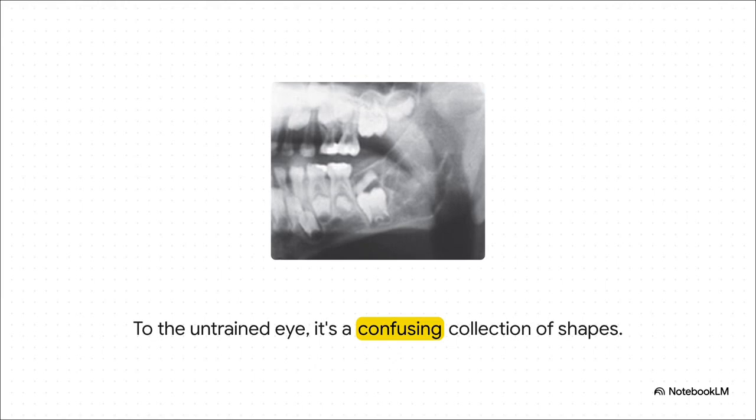Okay, let's just dive right in. I mean, look at this X-ray. For most of us, it's just a jumble of light shapes and dark shapes. It's a total mystery.